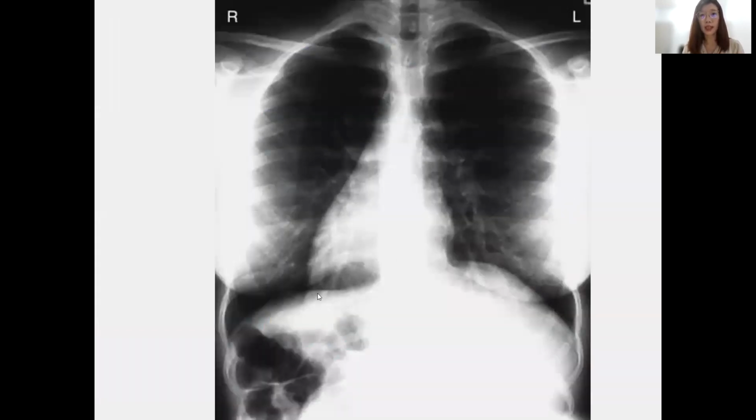So first of all, this X-ray is showing dextrocardia because the markers are correct for left and right, and they specifically labelled it. So if it's not, I will always check with the radiographer whether there's any rotation or mirror imaging while doing the X-ray. Always check with them.